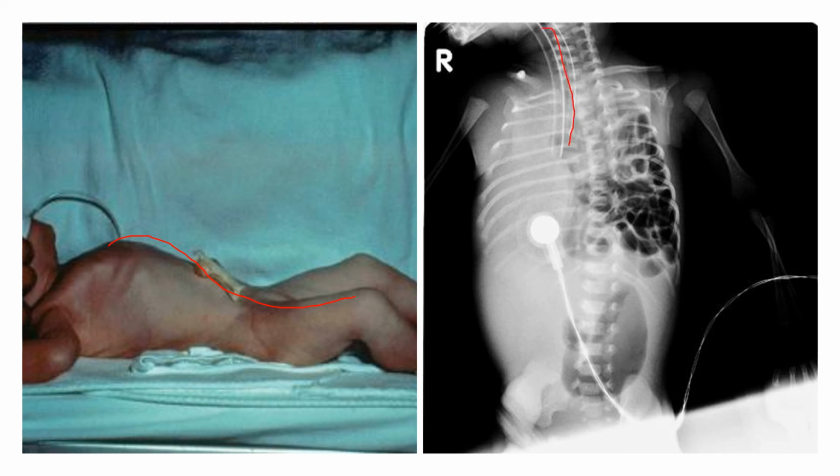And this is the ET tube that I'll highlight up here. Obviously, this kid's face is towards the right. You see this area, no lung tissue expanding. And then over here, this is not lung tissue. Right, this is all gastric tissue, and this is all gastric. This is all gastric stuff.